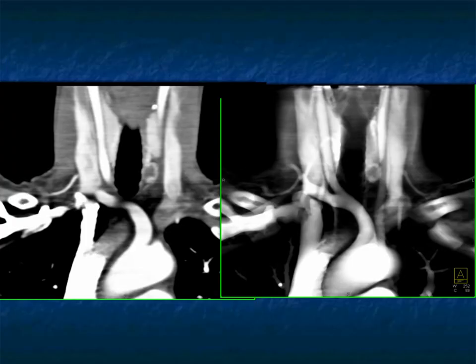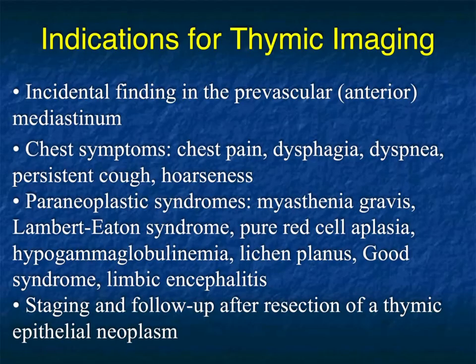So I've now shown you a range of parathyroid adenomas, maybe more than you've seen in the last decade or so, but you can see they're small, typically but not always vascular. You can see their locations, but the locations will vary, and the importance of really looking very, very carefully.